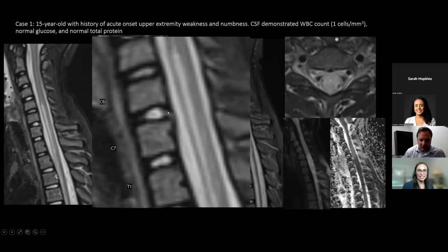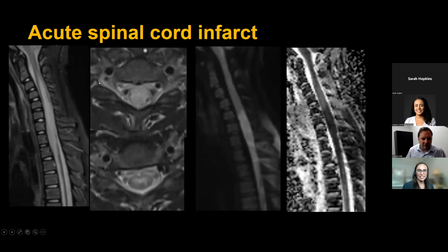So that's something called an annular tear. Now that means potentially there was a disc injury. And so if you think there may be a disc injury and you're seeing something in the spinal cord, you probably want to think of potentially the diagnosis of acute spinal cord infarct. And that's what we ultimately felt this was. That transition from more central gray matter rapidly to the whole cross section of the cord fit more with acute spinal cord infarct. And again, we don't really know about what AFM does on diffusion weighted imaging, but we're looking into whether or not that can help distinguish those two diagnoses.